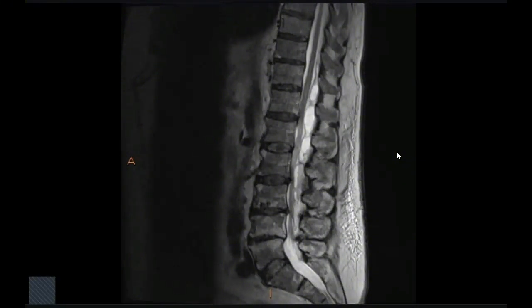So, given the history of recent lumbar puncture and collectively, I would suspect the presence of arachnoiditis in this case, and I would like to recommend reviewing the previous images as well as completing the scan with post-contrast images.